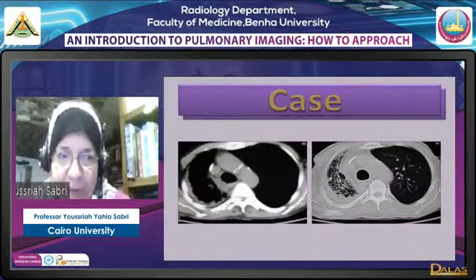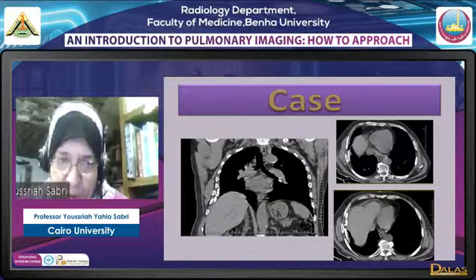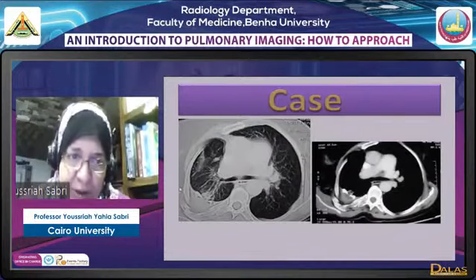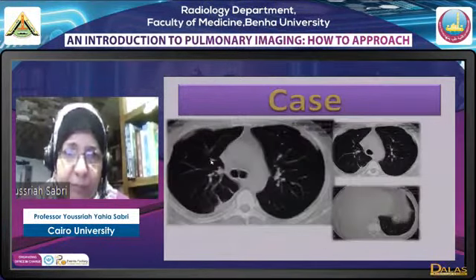Now we have pleural thickening and fibrosis of the lung with decreased volume. This is a case of fibrothorax and cicatricial collapse of the lung. This is a case of localized thickening of the pleura, a localized fibrothorax with intense calcification and decreased volume of the right hemithorax. Another case with fibrosis, decreased volume and calcification, and as I said, we have seen this before, this is round atelectasis.